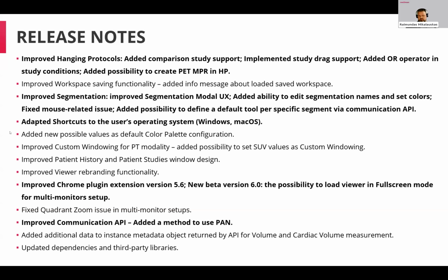We slightly improved rebranding functionality. It's easy to rebrand the system. We had a bug with quadrant zoom with multi-monitors. We fixed it.